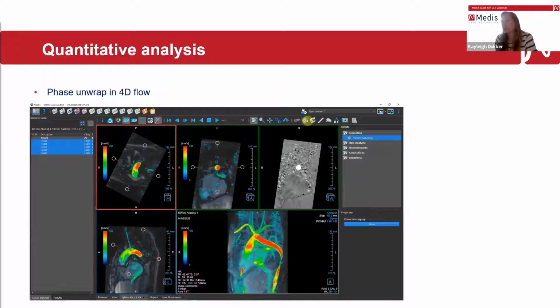It will also distribute it to the analysis that you might have already done. So if you had already done an analysis for this phase in the QFlow 2D application, then it will also be updated afterwards. I will show you that as well in the demonstration.